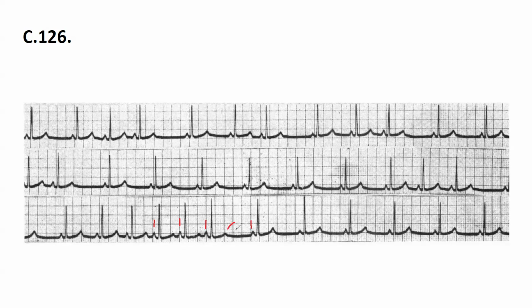So it's really a small heart rate. It's not a small heart rate, because if you calculate the average, it's not bradycardic. This is about normal. You can count it if you wish, but I don't think it's so slow. Okay, let's calculate it. Let's go for this one.